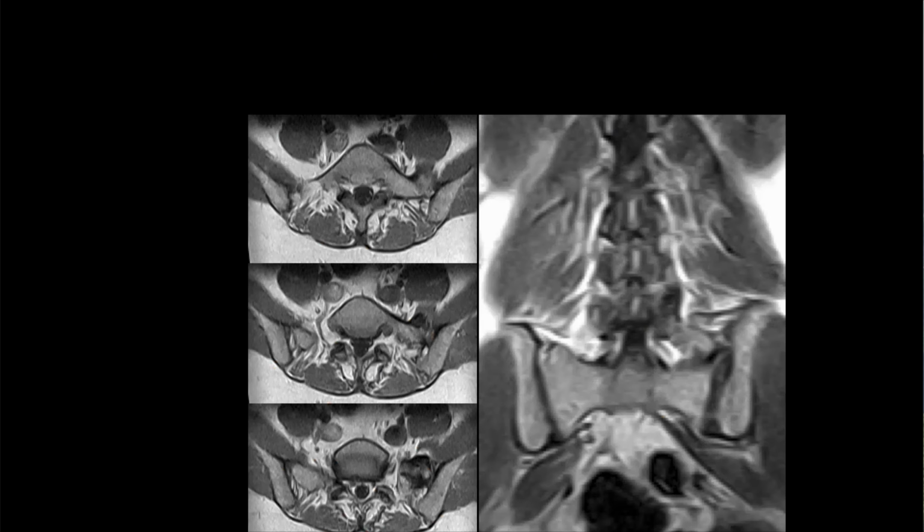All right. Payson? Do we have some sort of transitional anatomy here?